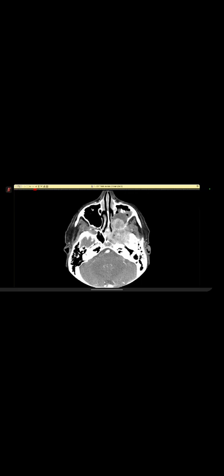Of course, it has gone into the coronal. Even here, actually, at the edge, we can see it. So it is going into the cranial cavity. So this was picked up, which was fine. But posteriorly, all of this exercise is about what else is involved, things like that. Okay, overall you did well.